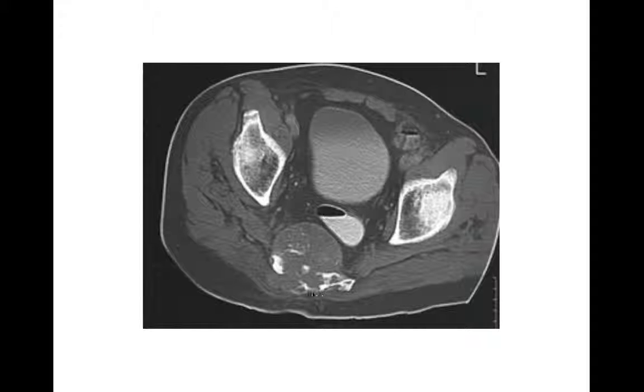Here's a radiograph showing you. You can see there's kind of like this density overlying the sacrum. You can't quite see the arcuate lines. You wonder what kind of matrix is going on in here. They went on to advanced imaging. We can see this lesion in the sacrum. It's got a soft tissue component, it's expansile, and it's got some internal matrix within it. This one turned out to be a chordoma.